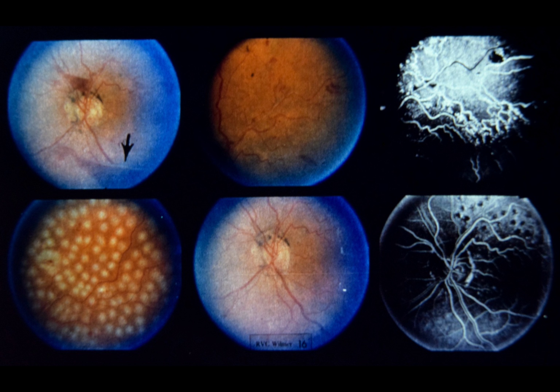Also, note plasma erythrocyte separation in subinternal limiting membrane hemorrhage below disc. Upper center, note extensive capillary dropout, sheathed vessels, and several areas of intraretinal microvascular abnormalities in distribution of superior temporal vein. Upper right, fluorescein study documents retinal non-perfusion in superior temporal fundus. Arrow points to dilated capillaries temporal to fovea, which are shunting blood across horizontal raphe from superior temporal fundus to inferior temporal fundus. Retinal hemorrhages obstruct background choroidal fluorescence.